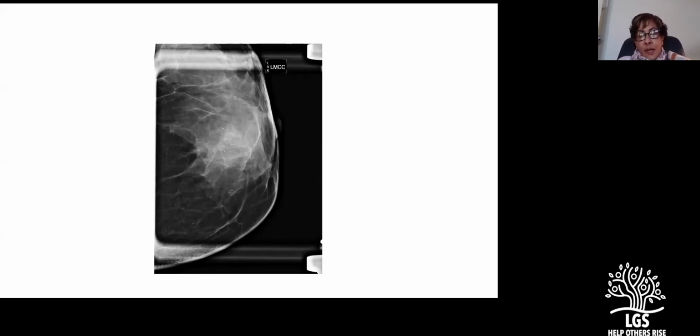Of course, now everybody does tomosynthesis, so it would have brought out the point. But I do believe that there is a density associated with those malignant calcifications. It would probably show up on a tomo, but spot compression magnification would also have shown it. In my practice, we tend to do ultrasound-guided biopsies, and if there is a soft tissue density associated with it, we would just do a true cut biopsy. And that would have solved the problem.